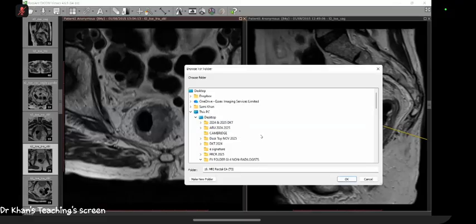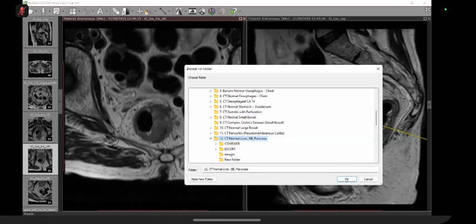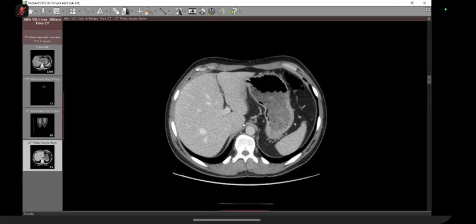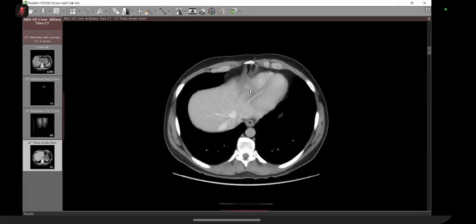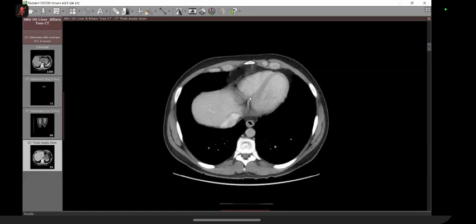Now our good old CT. This is now our area of interest, the liver. On axial slice, we are in the lungs. Now, as we come down, we have got the liver.